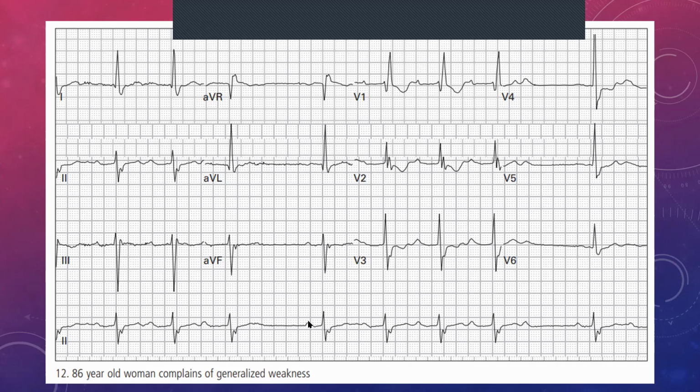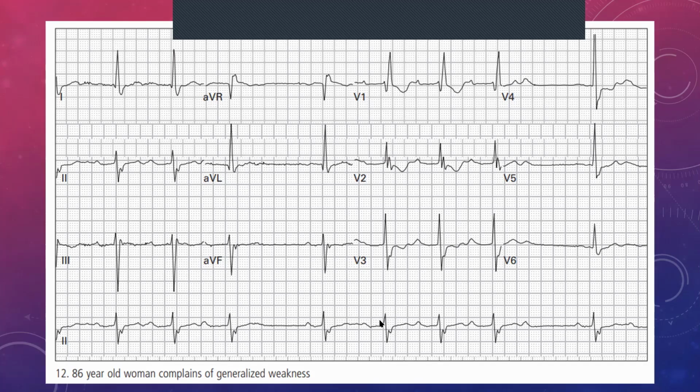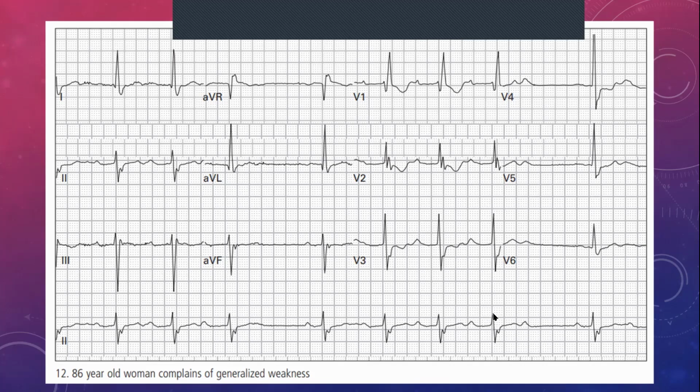if that pattern follows. So here again, we've got about, let's say, 7 to 8 blocks between our P and our R waves. When we come here, we can see we're going a little bit over that. So now we're up to about 9. And then when we come here, we see we're also about 8 or 9. So it hasn't elongated too much there. And then when we come here, we're getting closer to, I would say, about 9 or 10 again, just a bit of elongation, and then a drop over there. So our PR intervals are elongating.